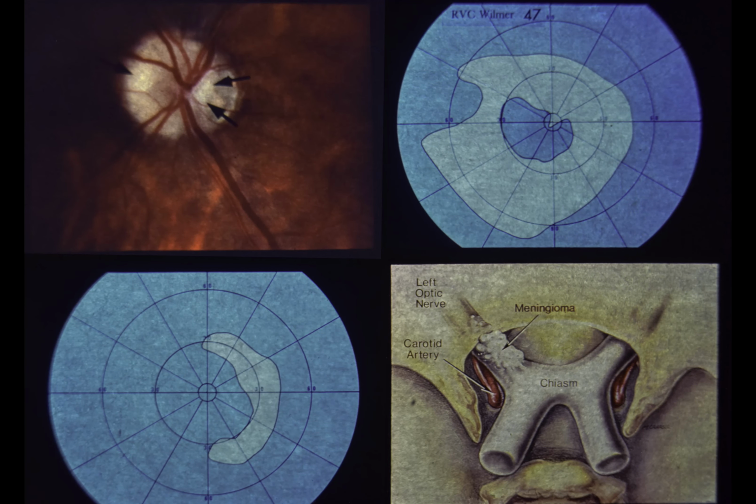Slide 47. Optic disc drusen and intracanalicular meningioma. This 18-year-old male complained of slowly progressive visual loss in his left eye. The right eye was normal. The left eye had 20/100 visual acuity, defective color vision, and an afferent pupillary defect. Slit lamp biomicroscopy showed definite optic disc drusen. Upper left. A magnified view of the left optic disc demonstrates mild pallor and optic disc drusen. Upper right. The visual field, left eye, shows an irregular peripheral depression with a pericentral scotoma that involves fixation.